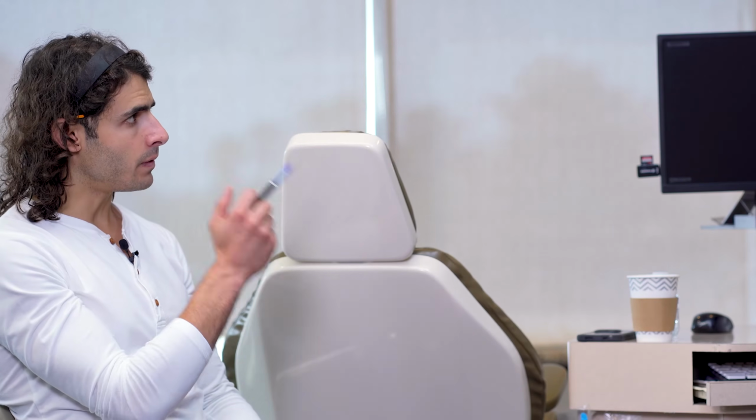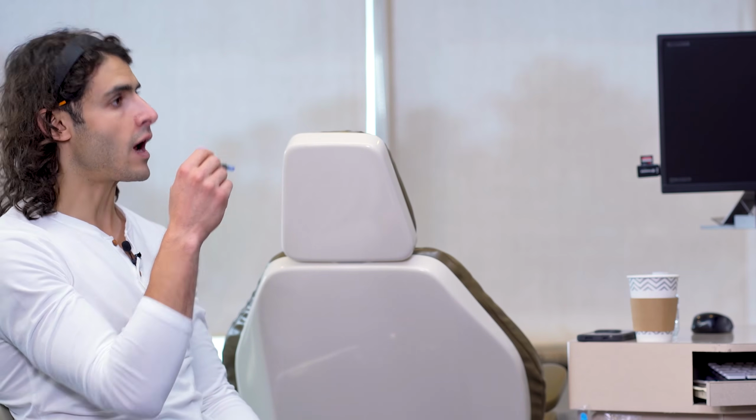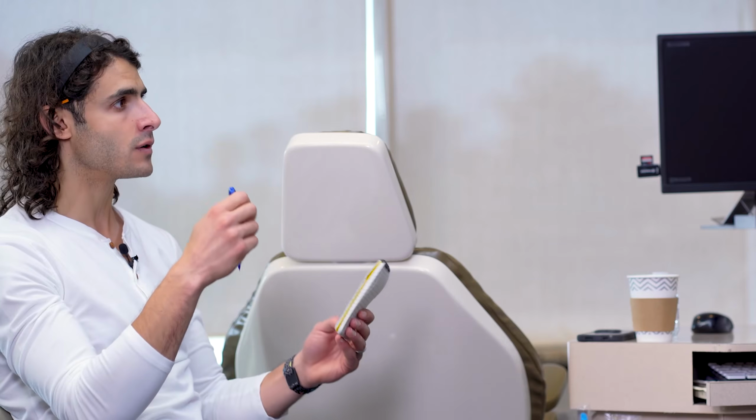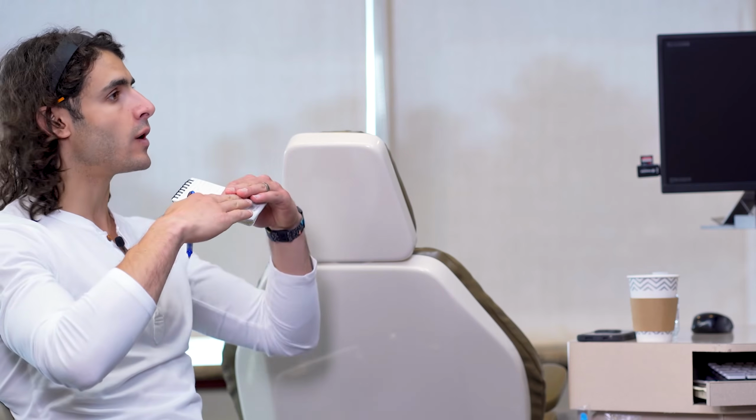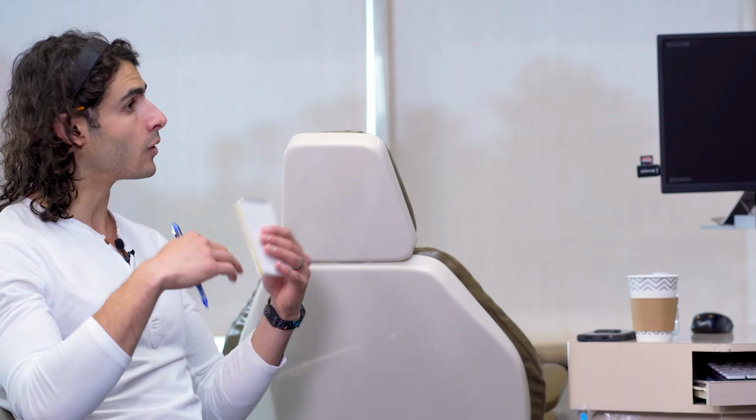And right now, it's fairly well controlled, but again, we can't look at every single spot where the maxilla attaches to the rest of the skull and know exactly how much resistance all of those points are going to have. How does the approach that they take differ from Dr. Lipkin's rule of thumb, which is to make the expander parallel to the bite plane rather than to the palate itself, because sometimes they differ, and if you always follow the palate, sometimes you create an asymmetry or a cant that way.